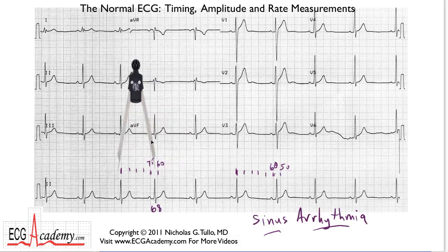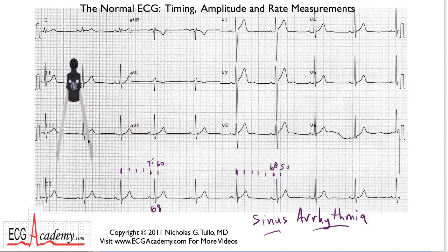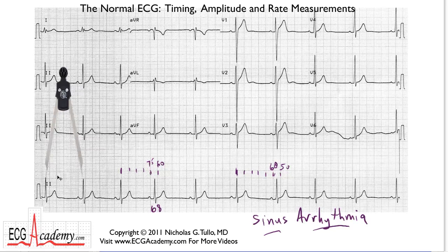Now the cool thing about calipers is it lets you measure things that don't land exactly on a heavy line, and I'll show you how. Well, let's go back to this first interval here, and we're going to put the point of the caliper on the first beat, and the second one, I could probably resize that a little bit better so that it lands on this second beat, okay? So now that's showing us exactly how long the interval is.